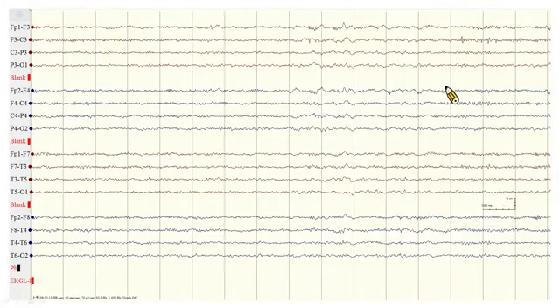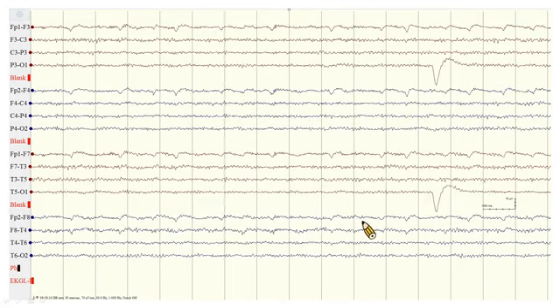This is another patient's EEG. We can see transient diffuse slowing here. But is this abnormal? We can see the posterior dominant rhythm is broken, and there is no obvious eye movement, so the patient may be in drowsy state. After the patient wakes up, the eye blink appears, and the posterior dominant rhythm resumed. So when we want to say the EEG has diffuse slowing, we must take into account the patient's condition.